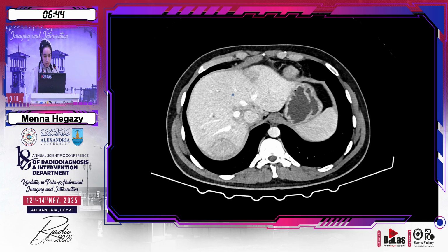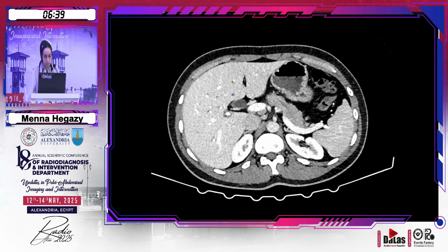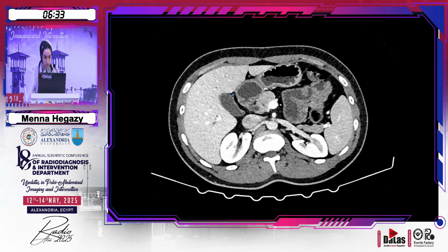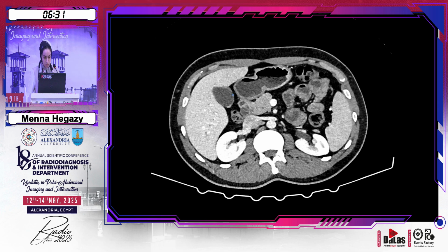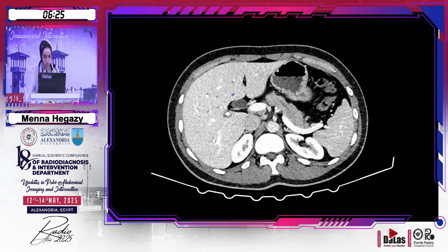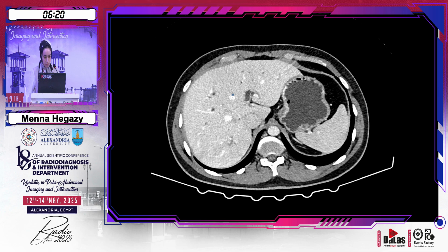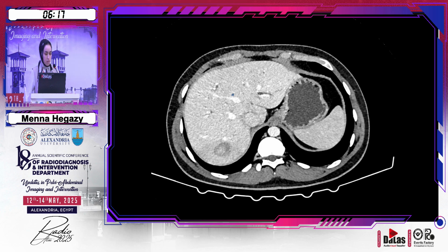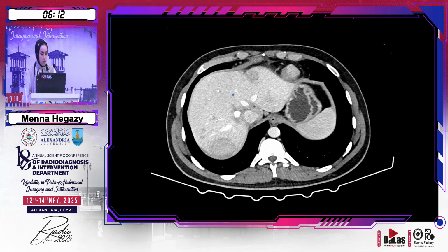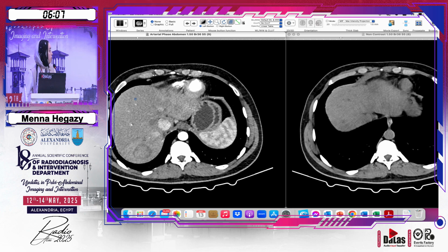This is the venous phase. And this is the arterial phase.